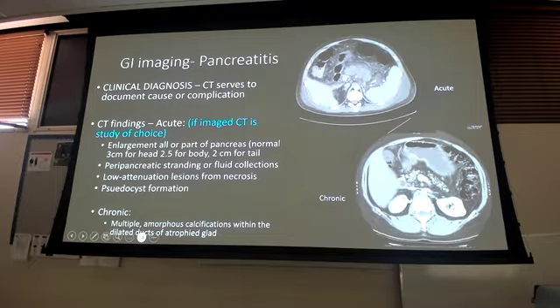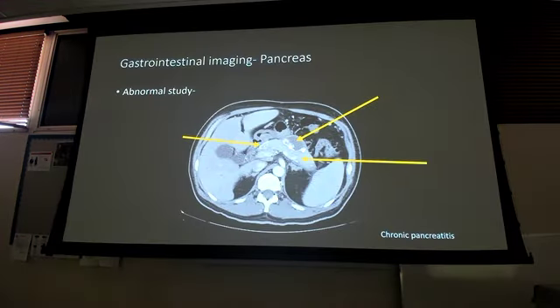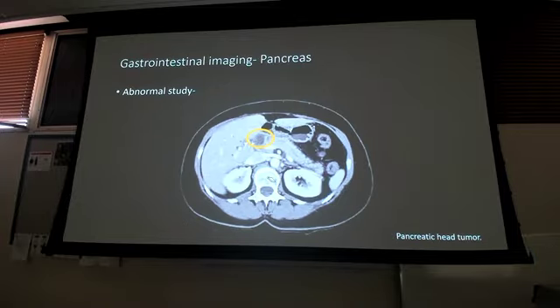Might get some pseudocysts, okay. So pseudocysts sitting off the top here. Might get some of those. Here's another pancreas. It's calcified. It's got a pseudocyst on it from chronic pancreatitis. Have an idea of where it's at. It's always in the central area of the abdomen. It can be hard to see. The CT is going to be your study of choice for pancreas issues.